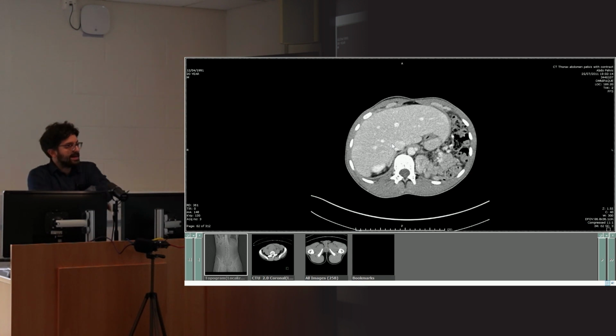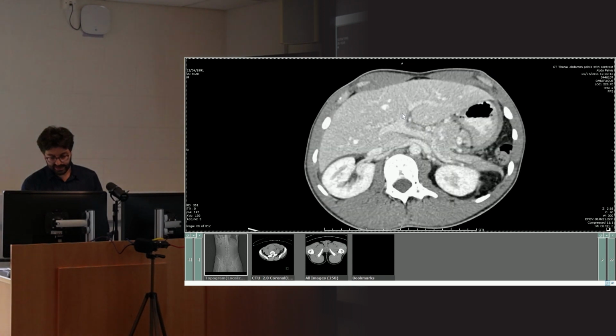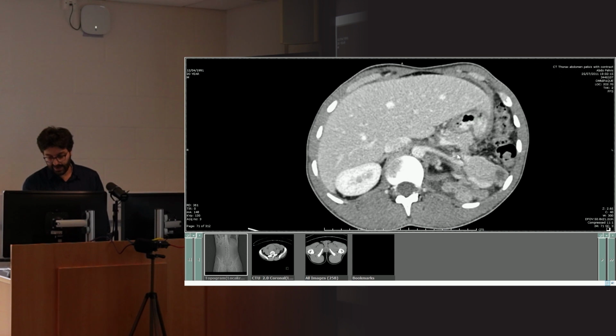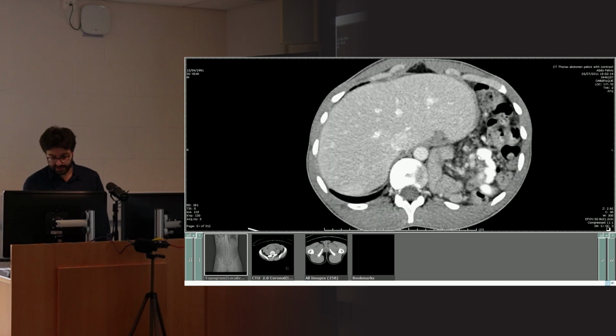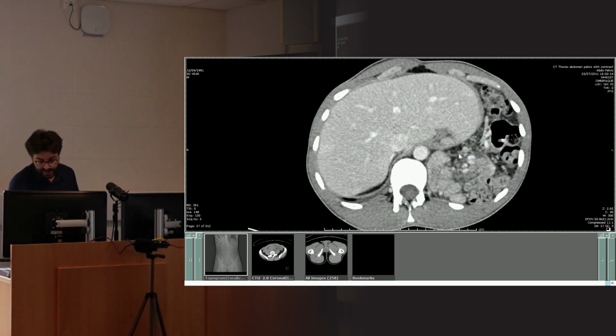So what did we talk about when we were talking about the portal vein, the SMV, and the splenic vein? What did we talk about related to the splenic vein? What organ is closely associated with the splenic vein? Pancreas, absolutely. So we are going to follow the portal vein. So this is the portal vein here, comes across into here, right? And then you've actually got SMV heading upwards, supplying all these bowel loops into the chest.